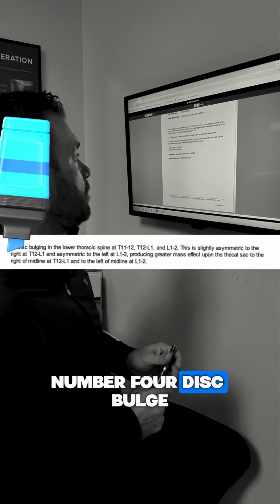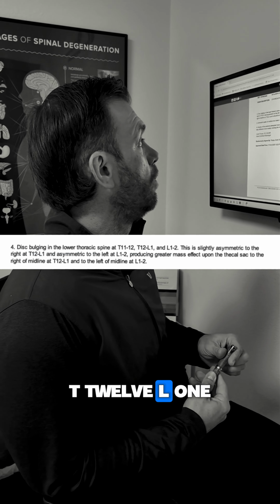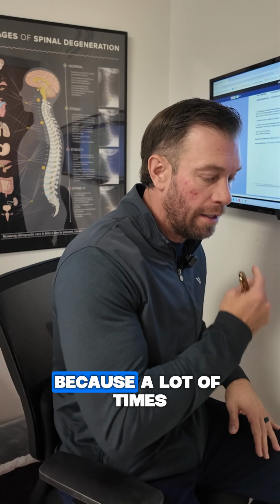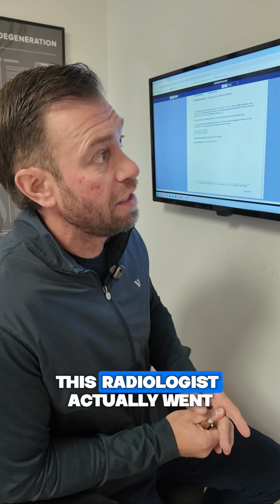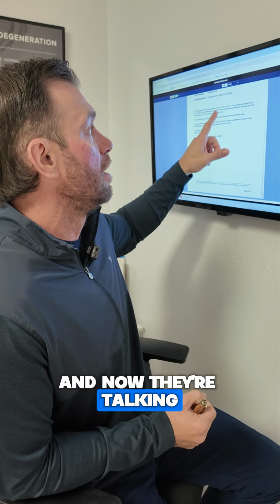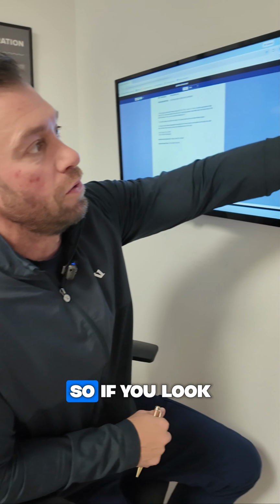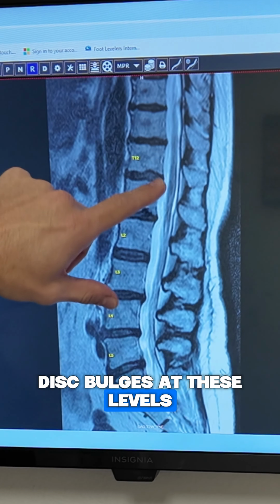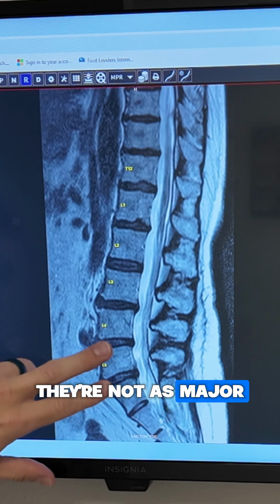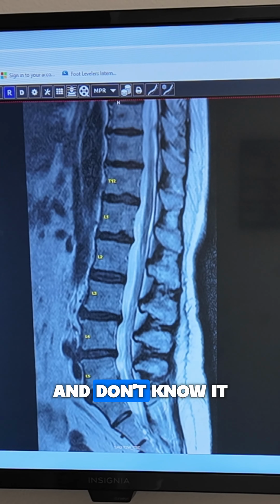Number 4, disc bulge, lower thoracic spine, T11, T12, L1, L2. So they did a really good job, because a lot of times radiologists will only stick to the script. This radiologist actually went above and beyond, and now they're talking a little bit more about the thoracic spine, which we call the mid-back. So if you look at that right here, they're talking about some disc bulges at these levels right here. Now again, they're not as major as these, they're just bulges, and people walk around with bulges all the time and don't know it.